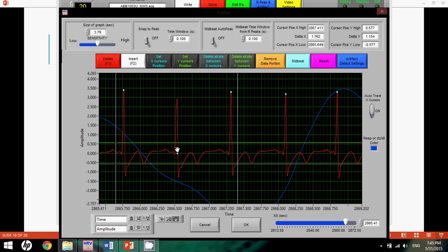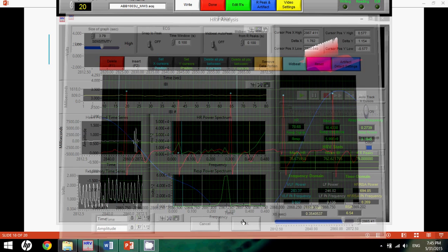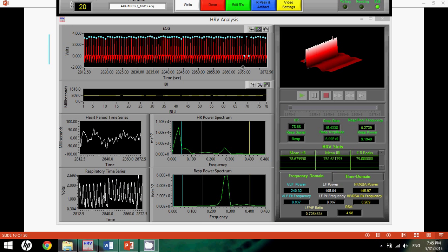And you can see that again, it's just a little bit off. However, that little beat could make a big difference when it comes to the RSA. So after fixing both of those points, you see that the IBI channel evens out pretty dramatically, and so we'll just do that, and when we go into our editing notes, we'll mark our editing notes as 2 mid-beats.